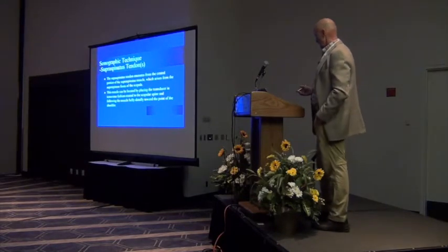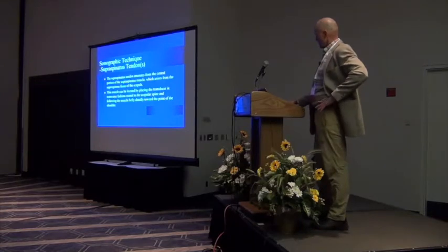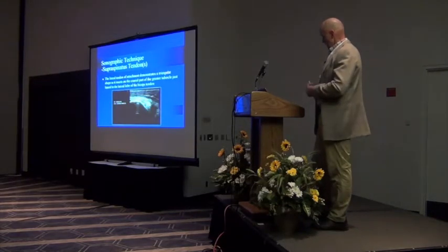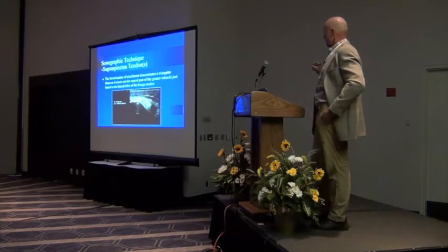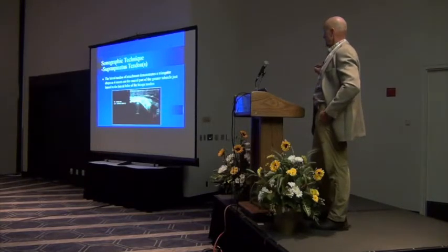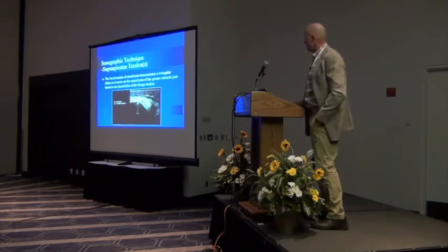So the supraspinatus, I've already shown you it's two muscles. It's going to form two little bundles. That's what it ends up looking like right at that greater tubercle. It's a little triangular shaped bundle. Here's the lateral lobe, and this is that area that will fill with fluid and synovial material.